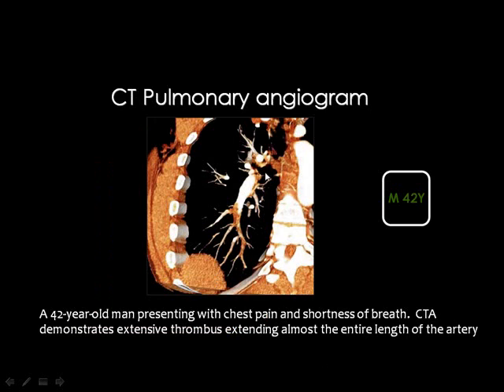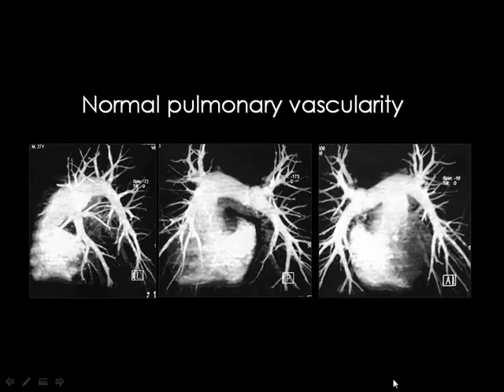This is an example of a pulmonary embolism. This is the patent vessel, and this is the thrombosed vessel, and you can see the infarcted area in the lung. And the machine also has the ability to remove any undesired structure in the image. Now you are concerned with the pulmonary artery and the branches, and you don't need to see the lung, you don't need to see the chest wall, the ribs, the spine. Any structure you don't want to see, you can remove it from the image.